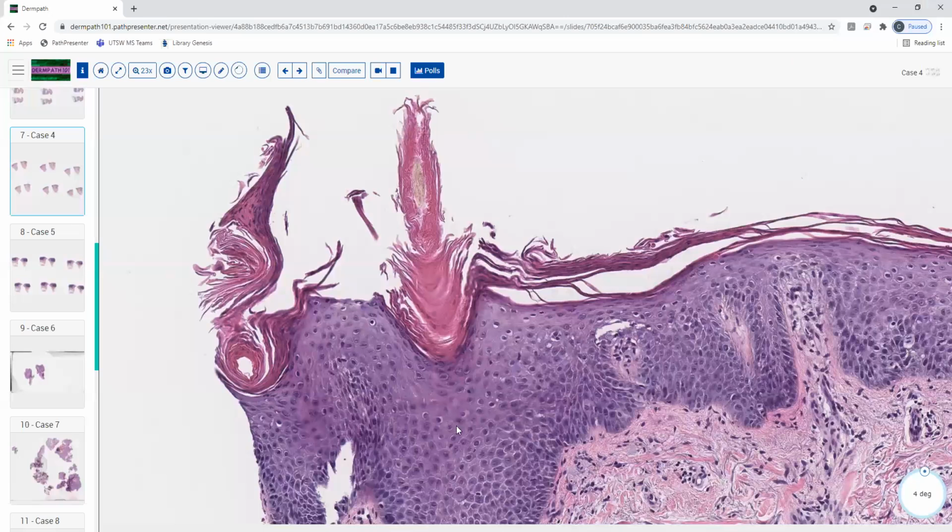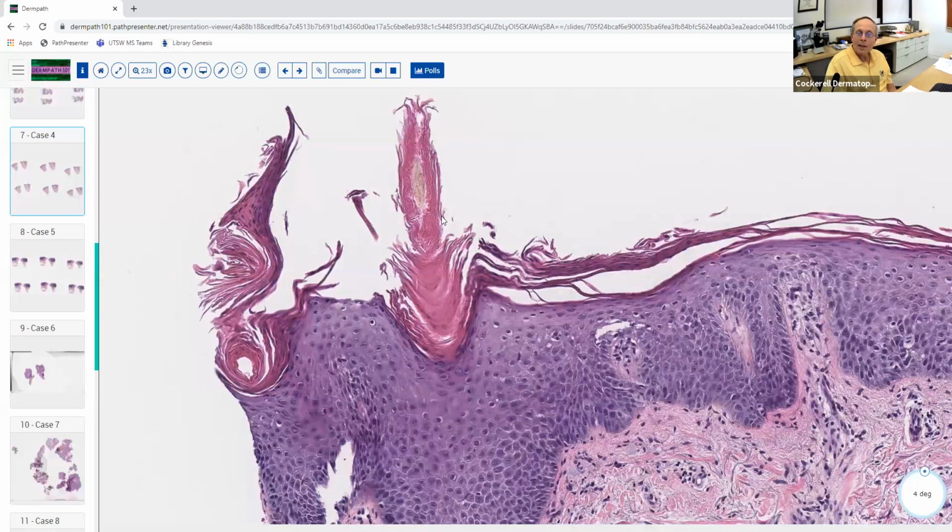Oh, yeah, it almost looks like it spares for the most part above the follicle, and then it has adjacent areas with parakeratosis. I'm blanking on a specific name for that. What's this little thing here that I'm pointing out to you? And actually, it's also here too.